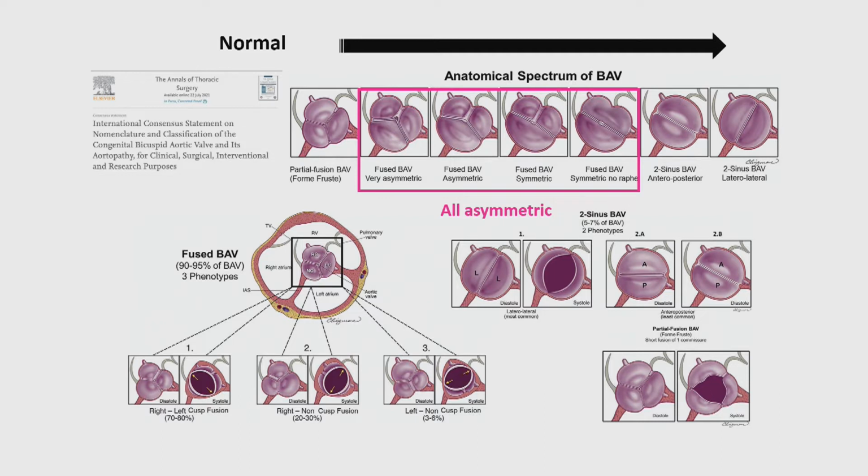And the reason this is important is this is not stenosis, but when it comes to regurgitation, you'll quite often get prolapse of one of the large leaflets, and it's easier for the surgeon to repair it if it's quite symmetric, because they make it a bicuspid valve, like the one on the right-hand side here. They do what's called bicuspidization of the valve, and that's easier to do than trying to make it look like that.